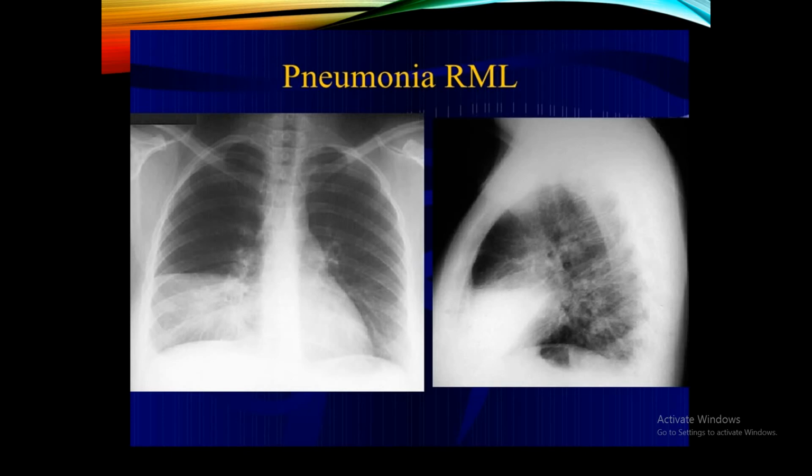Another example of patchy opacifications in the right lower lung zone. إذا تلاحظون ال PA chest X-ray, this patchy opacification is limited superiorly by a very clear line. هذا اللاين يمتد من الهايلم إلى اللاترال chest wall، وهذا هو الhorizontal fissure. إذن we have patchy opacifications، وهاي patchy opacification not associated with any loss of volume، مثل ما تلاحظون أنه الميديستاينم سنترال، لأنه patchy opacification في هذا المكان usually causing mediastinal shift أو elevation of the diaphragm. Neither of them is present، فمعناته the patchy opacification is not associated with loss of volume.